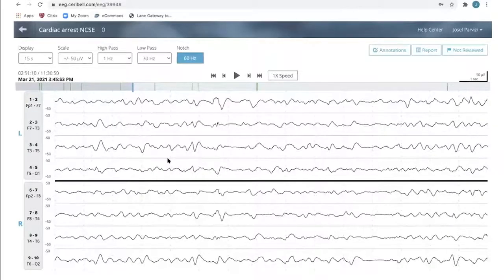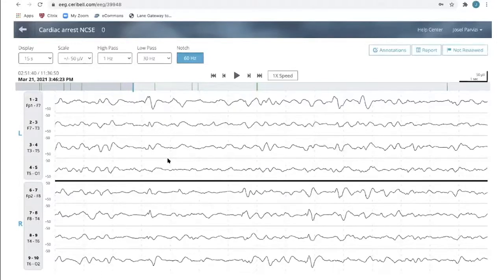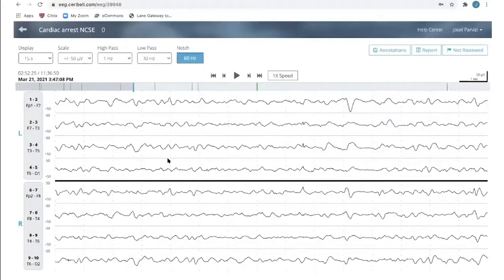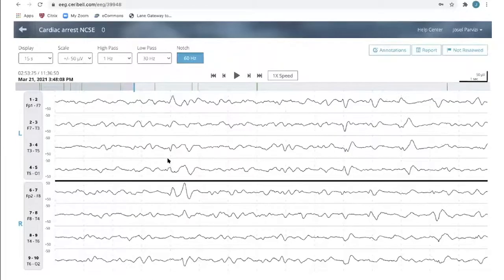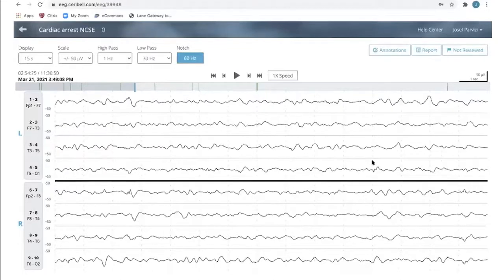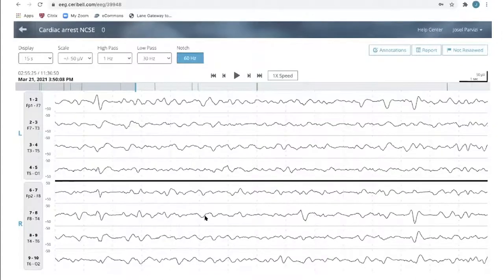And now we're into just more of a general slowing. Right. So for me, the response to treatment, the visual feedback that the Ceribell provides here is very useful in showing that this is an epileptic phenomenon that needs to be treated. Yeah, really nice. No, this is really great. You're seeing some of these waveforms a little bit blunted, but clearly you got rid of that aggressive 2 to 3 hertz spiking wave, generalized periodic discharges.